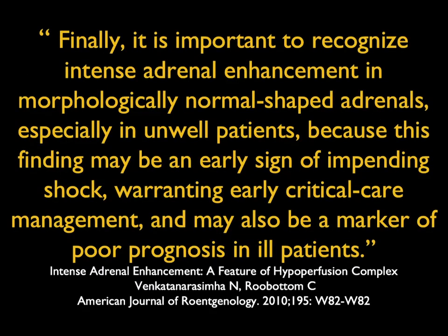Now, there have been several articles. This article by Venkatarasammy, from London: it's important to recognize intense adrenal enhancement in morphologically normal-shaped glands, especially in unwell patients, because this finding may be an early sign of impending shock, warranting early critical care management. It may also be a marker of poor prognosis in ill patients. So again, you can't underestimate how important this is.